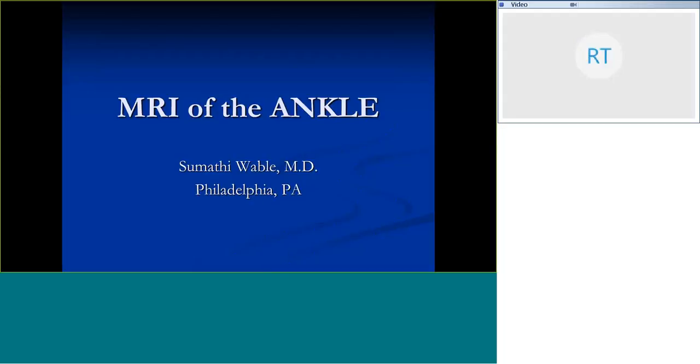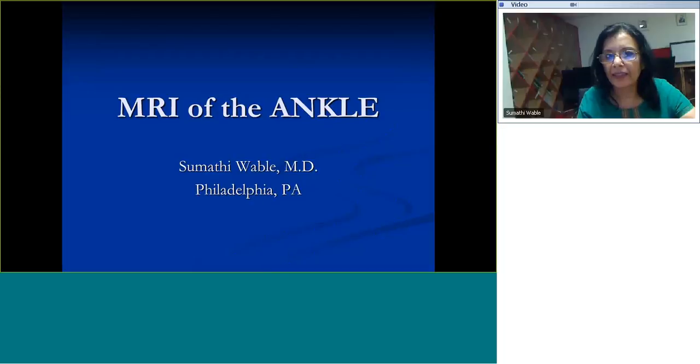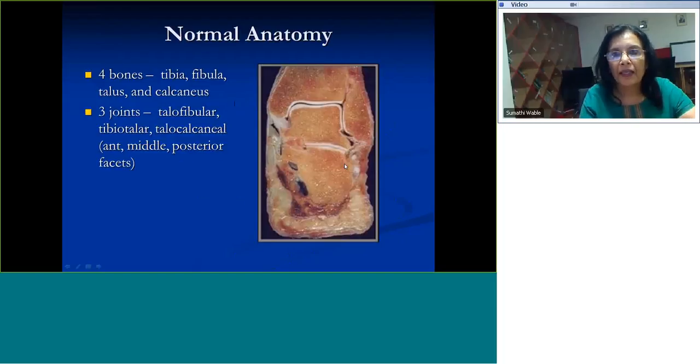Today we are just going to review some basics of MRI of the ankle in terms of how to obtain the best images and also interpretation of some of the common pathology. Just to review the anatomy before we get into the MRI portion of it.